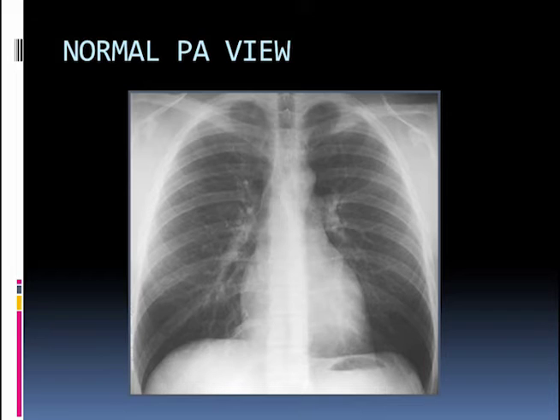Now if we go to the right side and start at the top, there's a line that comes down straight from above and ends at the level of the right atrium. This is formed by the superior vena cava, and actually it's an interface, white on one side, black on the other for the lung. Immediately above the right main stem bronchus is a small almond-shaped structure, which is the azygous vein.